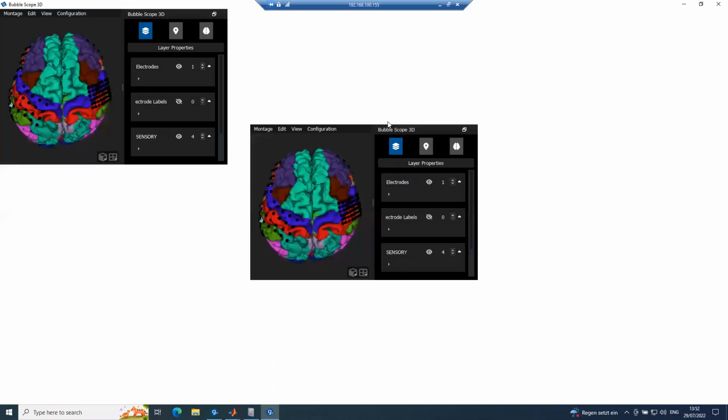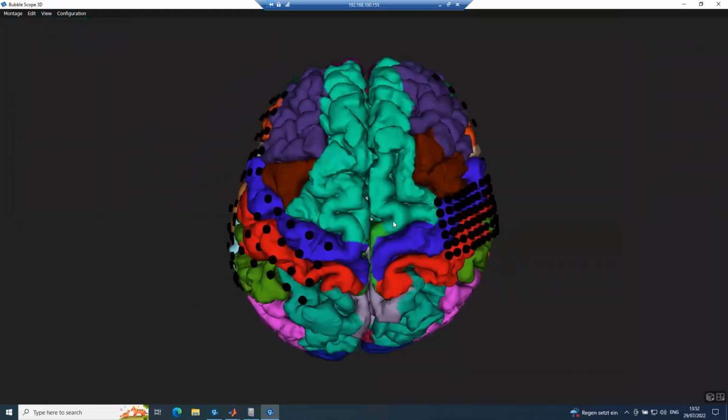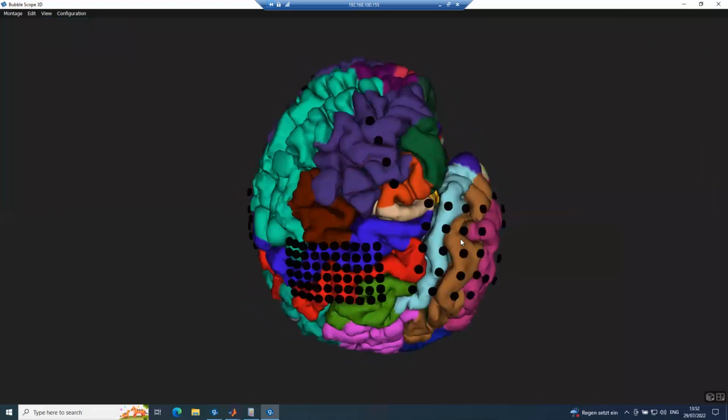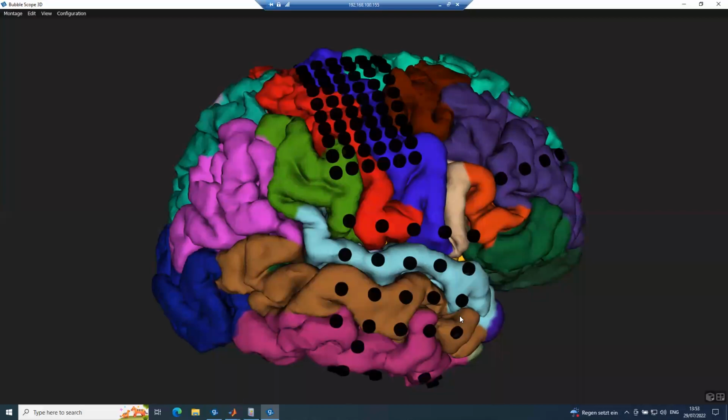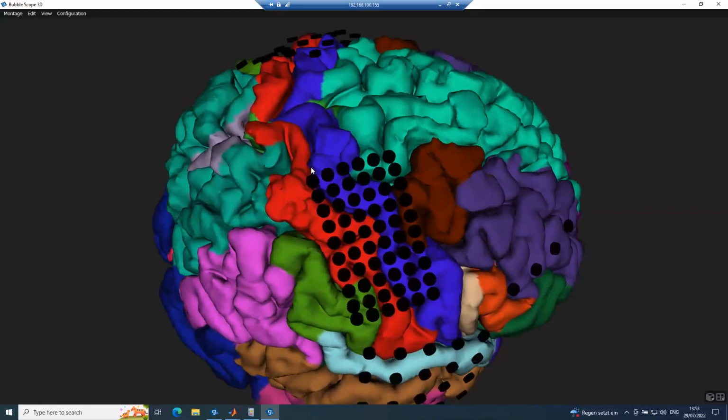And we see, as MJ also said before, we can color the brain with these anatomical landmarks. And we see here on the right hemisphere, so we have a left hand median nerve stimulation.